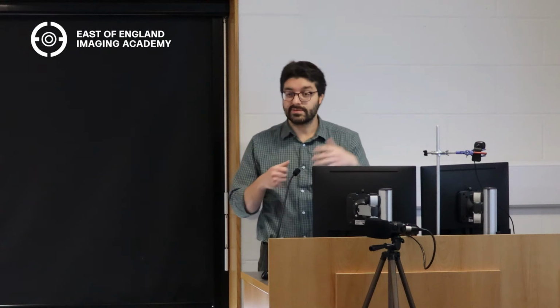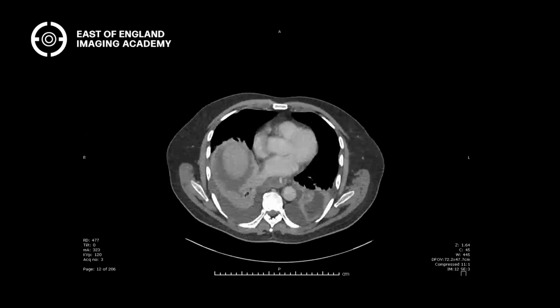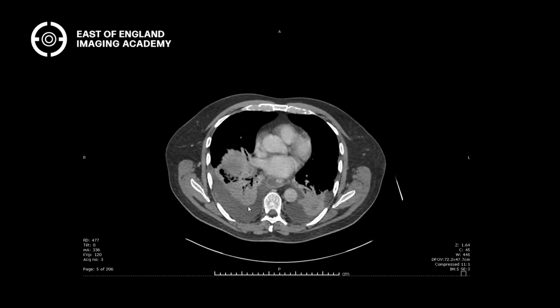It's not pleural thickening, but you're thinking along the right lines. This is collapsed lung, so this is atelectasis. Because obviously that fluid is taking up space that lung used to occupy, so the lung has to collapse in order to allow the fluid to exist, right? So that's just a bit of atelectasis. So first things first, pleural effusions.